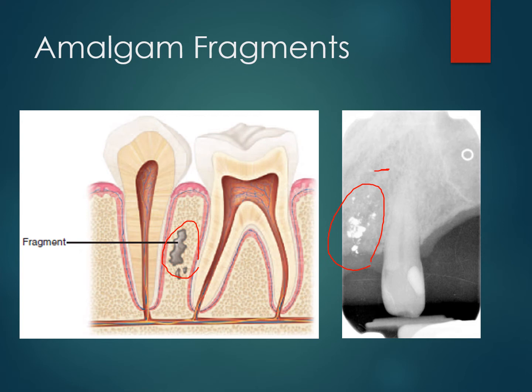And what happens is usually there was either another tooth that had a restoration, or maybe it was even this one. They don't usually do amalgam fillings on anterior teeth, but you never know. So maybe this was an amalgam filling before, and when they replaced it in order to put this composite filling here, some of that amalgam kind of flung off and was absorbed by this tissue here. And so then we see this. If we were to look inside this person's mouth, we would be able to see an amalgam tattoo, or a big blue purpley sort of blotch right here.